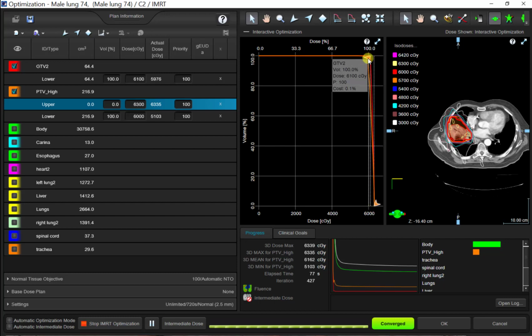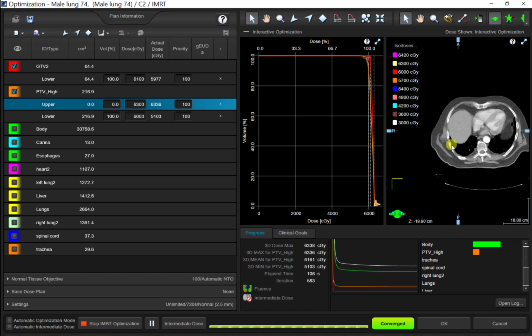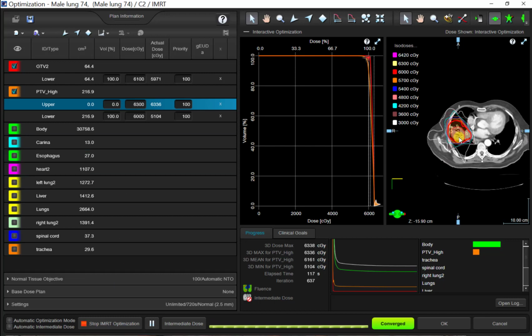But okay, so I like to start by getting my coverage like this. I think it's even more important to do it like this in IMRT planning than VMAT planning, because your beam arrangement matters quite a bit more for IMRT than VMAT. VMAT, you just have a lot more looks no matter what you're doing. IMRT, your plan will change drastically depending on what angles you use, what collimator angles, all of that type of stuff, right? So I like to know that I can get good coverage, that I can get a conformal plan, that I can get rid of hotspots, all that right away before I even start to mess with my OARs. So if my plan does not look good right now, just from a coverage standpoint, I know I need to go adjust my beam angles, okay?